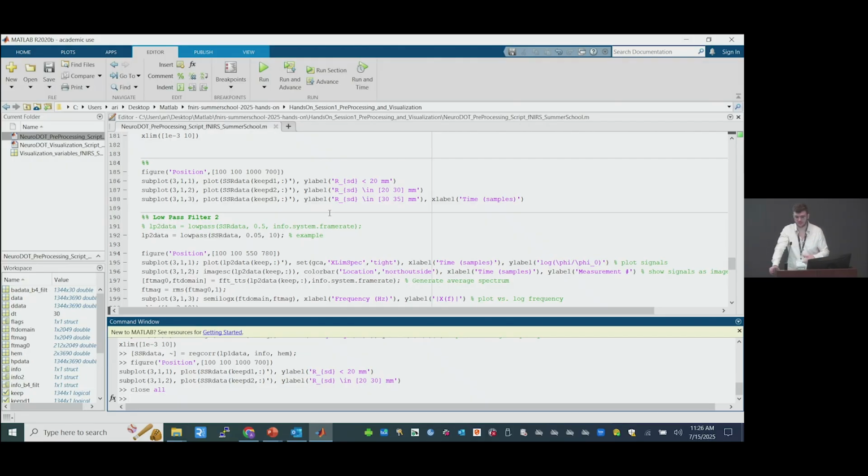Every individual step will have multiple figures for it. So in terms of how I actually process data, I look at those main 3 raw data quality figures, and then I'll process my data through this pipeline and then look at the resultant data after pre-processing. So for this section right here, I would say close figures as needed. The most useful ones that you may want to return to are those superficial signal plots and then the 3 raw data quality figures. Does that make sense? Cool.